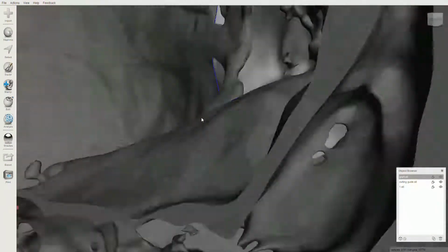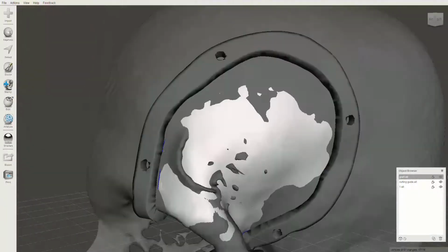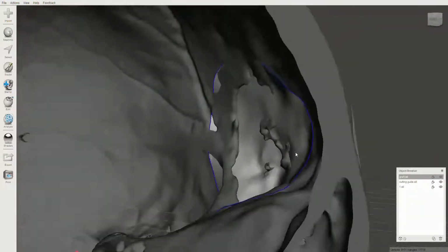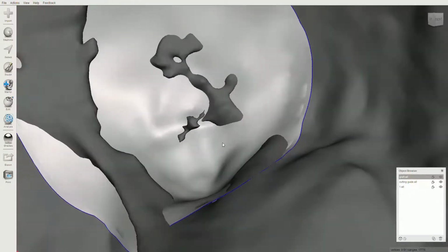Yeah, I'm totally satisfied with how this looks. Let's do some modeling.